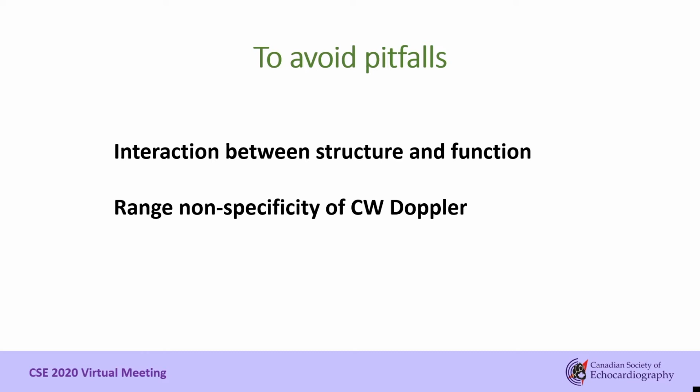When the valve appears to open well, it would be inappropriate to believe that it is stenotic based on the Doppler signal by itself. A more common scenario actually is a highly sclerotic immobile aortic valve and low transvalvular velocity. In that case, it also would be inappropriate to conclude that this represents mild aortic stenosis without further testing.